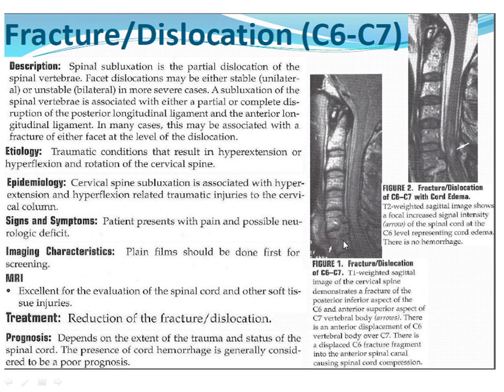So this one is showing the fracture of the vertebral body. There's a bit of a disc herniation from the trauma too. And this is a T2 weighted image showing this T2 bright signal in the cord. Unlike with the hematoma, where that was bright on T1 weighted imaging, this is just edema in the cord. This just means some fluid has built up in the cord. There's a good chance this could resolve.